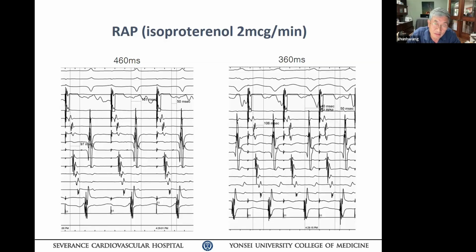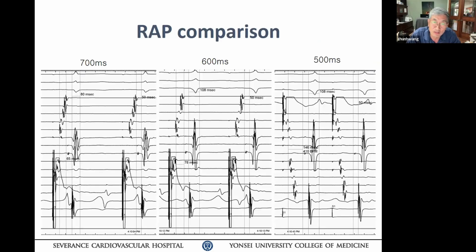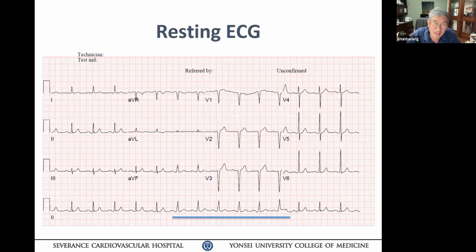And also the patient's baseline ECG, when you have a normal sinus rate, is the same, and then suddenly they develop this. Take a look at it. I think it looks the same rate to me when he showed me. Sinus rate doesn't change, yet there is gradual progressive increase in QRS.